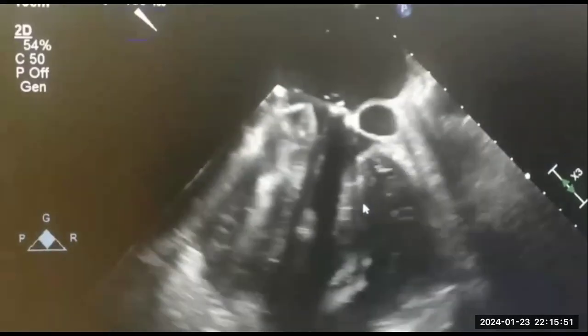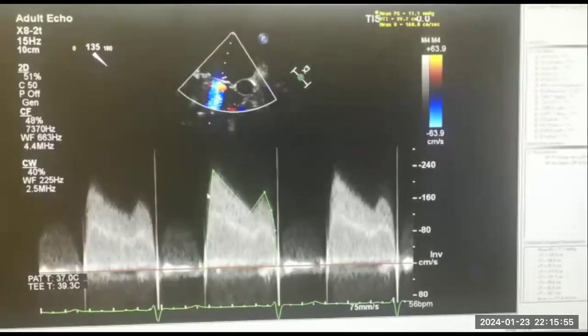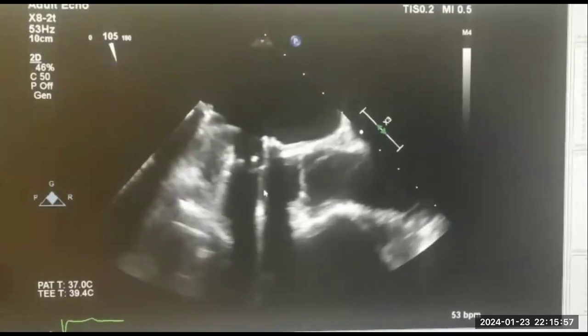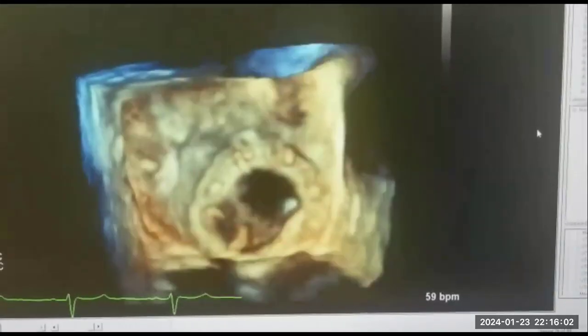So we should note, he should give you more views just to clarify what is the reason for this stuck disc. Is it something technical? Is there a thrombus, or is there a vegetation? What's going on with this?